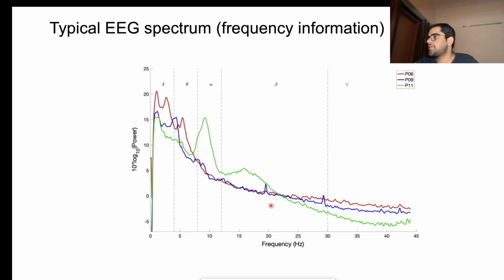So these are peaks in beta oscillations. Beta oscillations are also known in some feedback processes while making decisions, or in attention phenomena. So this is just a typical spectrum. If you know the task, I can tell you what significance this has, but this is just to depict what it is.